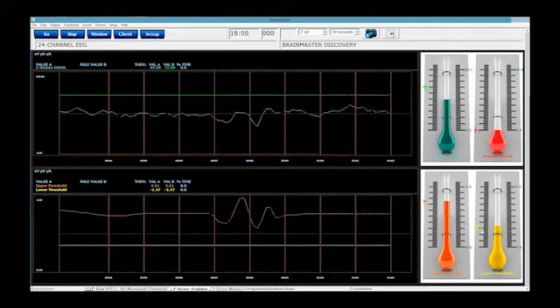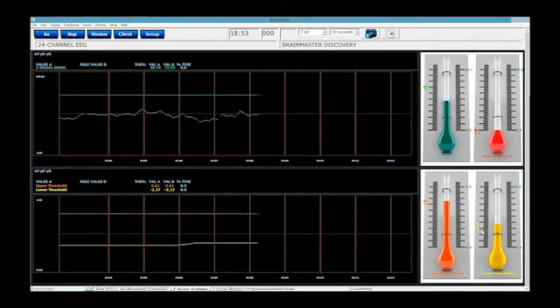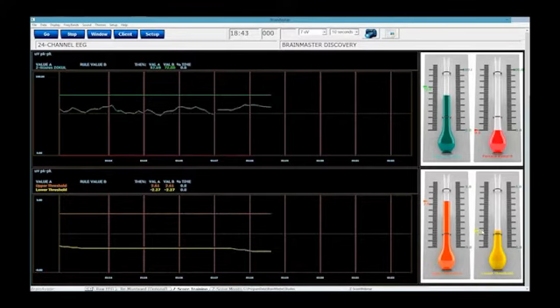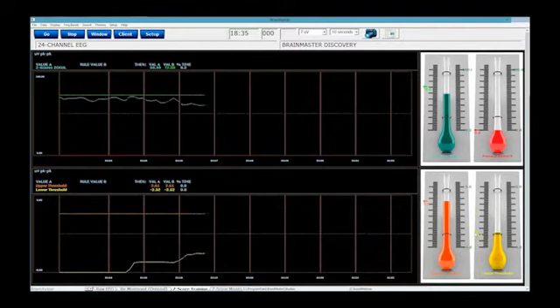And then you have a lower threshold that's independent that can be controlled by the L key. By hitting it, it goes up 1/10 of a standard deviation. And then the Shift L key, hitting that will lower it 1/10 of a standard deviation. Or, once again, I can control it with my thermometer right here. So that is the only real difference between those two.